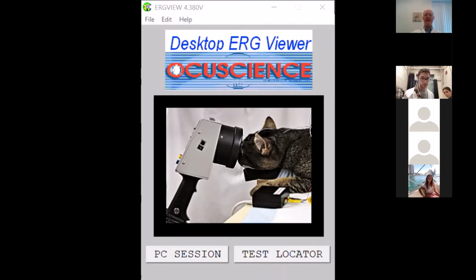In doing the data analysis, the ERG View software is our tool to basically take the raw data, present it into its waveforms, and provide a lot of tools to filter out noise from those ERGs, to measure those properly, and then to conduct comparative analysis of those ERGs, and basically be able to interpret the deltas between those ERGs in terms of what's going on with the eye.